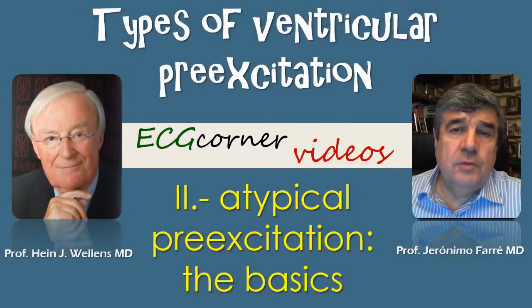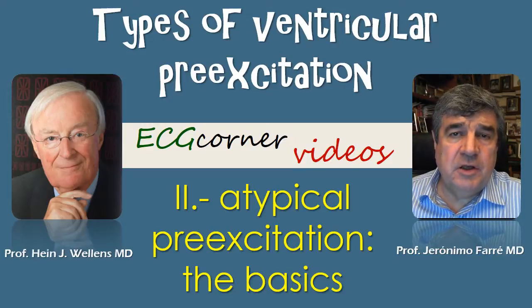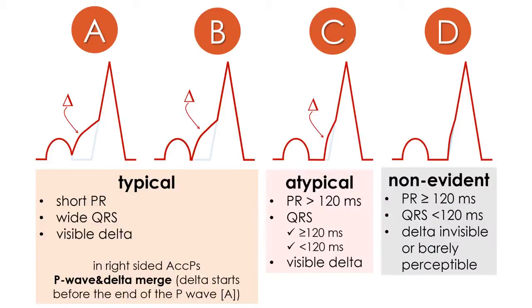In this video, we are going to explain the basics of what we call atypical preexcitation. In this slide, we show the 4 electrocardiographic patterns of ventricular preexcitation.